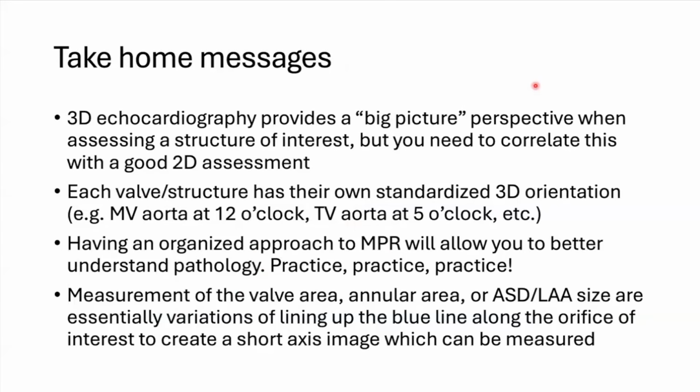And we talked a lot about multiplanar reconstruction. I find 3D helpful in that it provides a big picture perspective, but you need to correlate this with a good 2D assessment, and I can't say that enough. Your main decision points are going to be made based on 2D, but 3D puts it all together, and they're very complementary to each other.